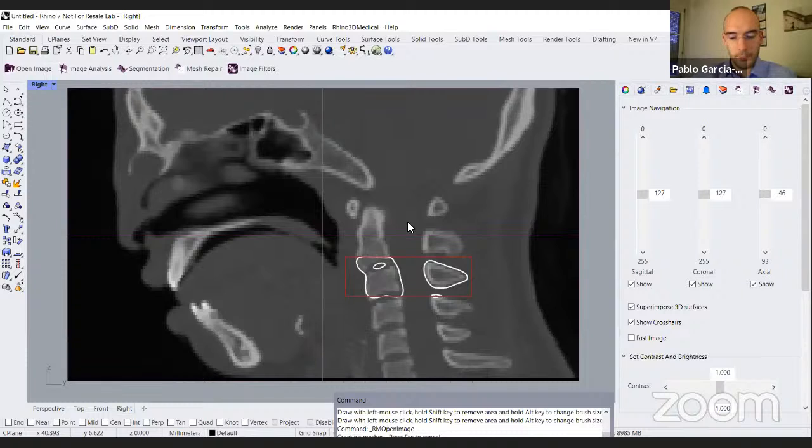Our plan is to first do things well in bone tissue, and do these things of segmentation, filtering, and mesh extraction, and then at some point develop them for soft tissue, which is trickier. But it's possible to do some initial things with soft tissue, like the lung extraction that I showed you before. Very broad representations, like the heart or the lung.